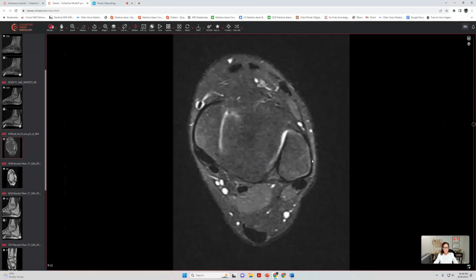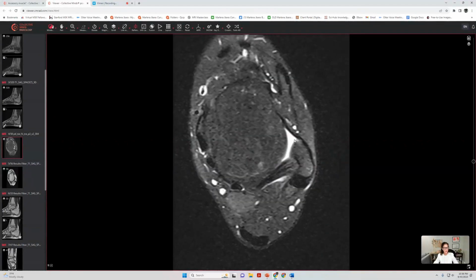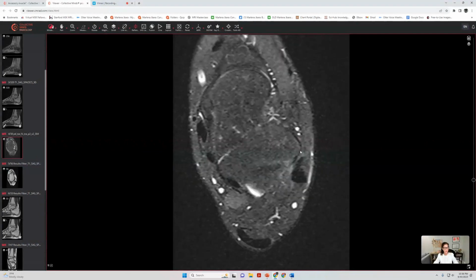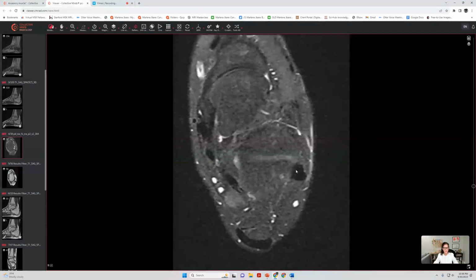Moving further down from proximal to distal, we have your anterior talofibular ligament clearly seen here. It's comprised of two bundles, and there's arcuate fibers which will connect the lower bundle to the region of the calcaneofibular ligament, which we can see here.